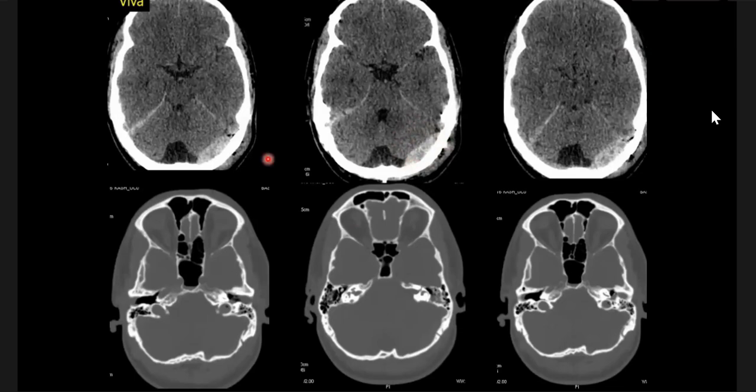I think it's, no, I will have to reconsider because of the lens of it. Again, it's an extradural hematoma, I would say. But I would scroll through. Explain that. How can it happen? Etiology. Trauma? Anatomy. No, extradural hematomas.